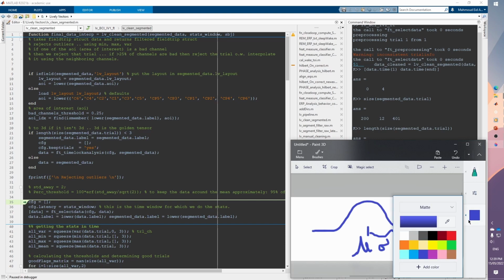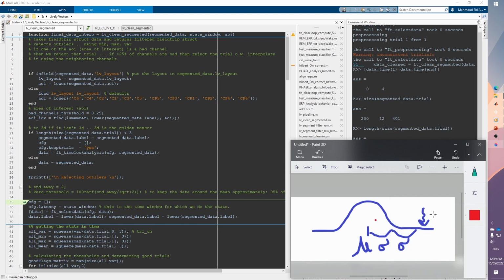So we can later on reject this and say that this is an outlier and I'm going to reject anything falling in this area. And we can do the same in this part and define our 2 standard deviations away that are lower than the mean, and then reject any trial or any signal or any sample, whatever we are doing, that falls in this area. This is of course if you are certain that your data is normal. So what will happen if you are not certain about this? We can then think about other things to do.